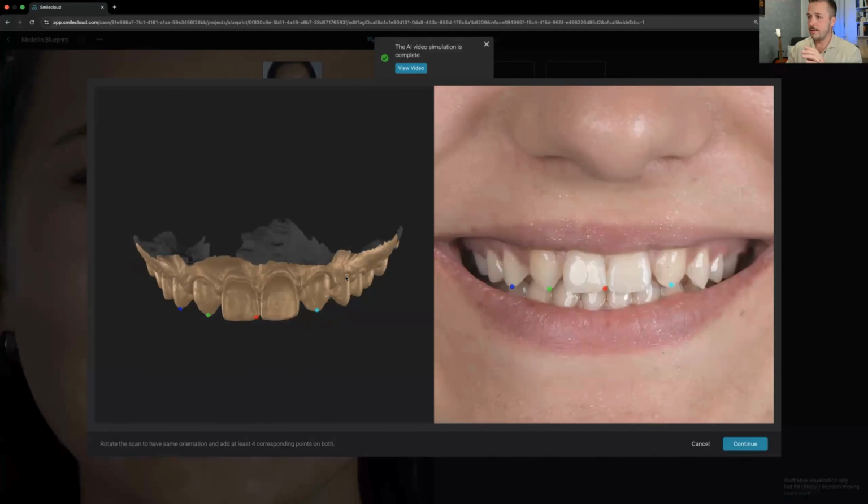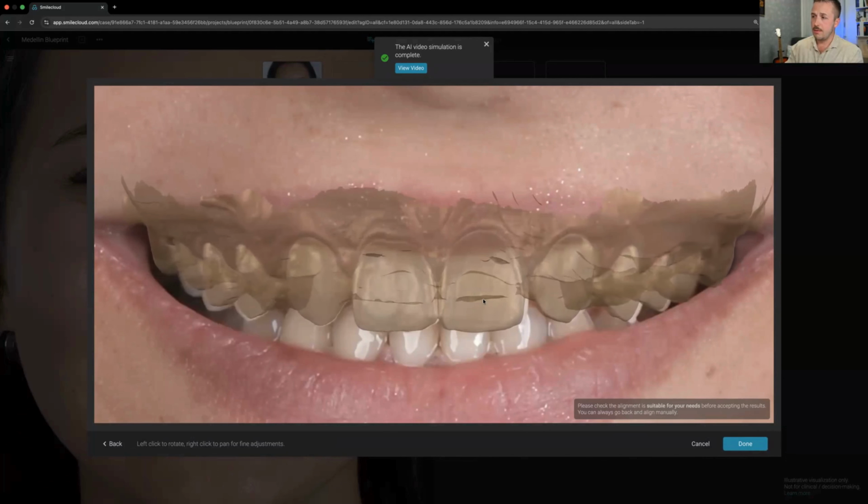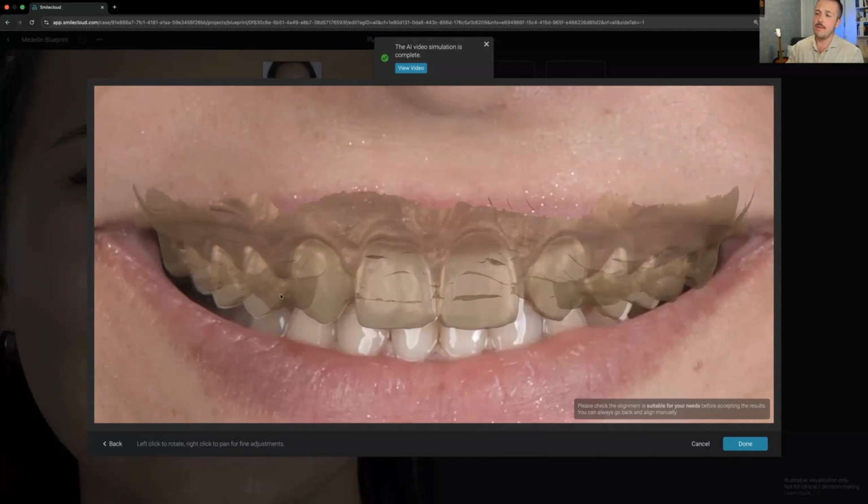Okay, let's say that to be more accurate, Florine always says we have to go with the cervical points as well. Usually you always have enough points, and then you get something of a better aligning than before. All right, so in this case, I'm still not happy. Usually I would just go back and realign again. Just for the sake of time, I'm not going to do that now. I'm just going to proceed further, even though it's not completely positioned as I would usually like it to be positioned.